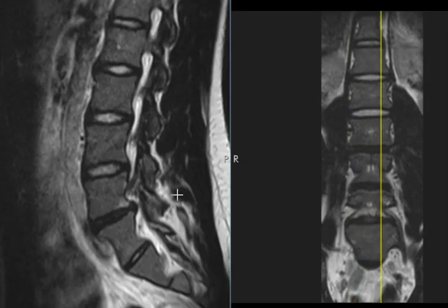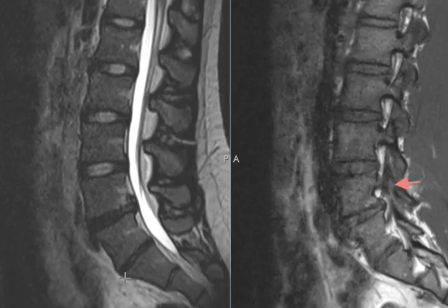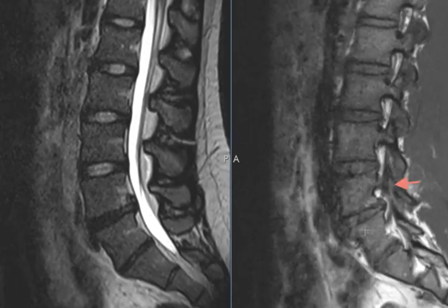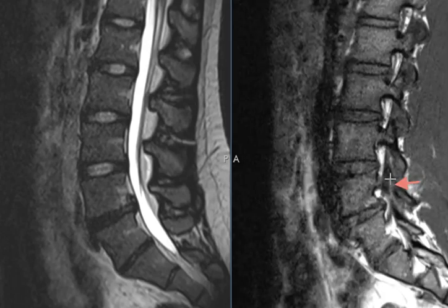We're going to go across to the left side, and the patient has the same thing. There's bright signal here, and we don't see that continuity of bone. I put up some thin images here to see a little better detail. And these images are T1, the patient moved, so these are a little bit blurry, but there's an arrow pointing to this vertical fracture line right here.